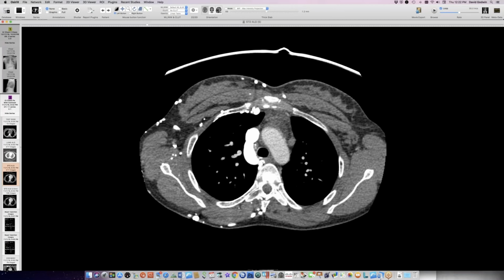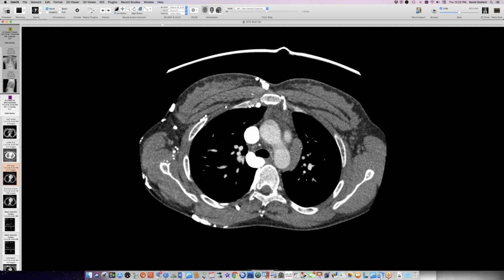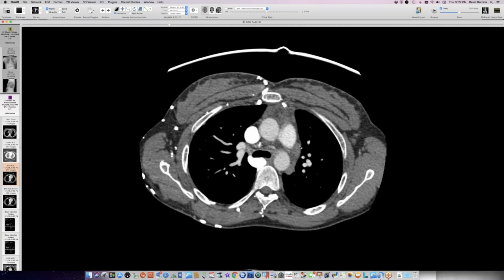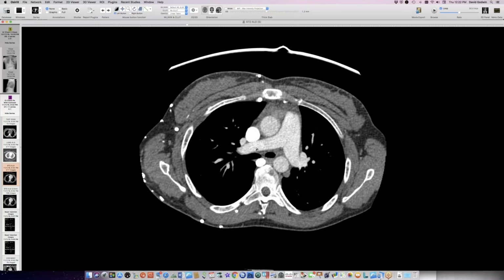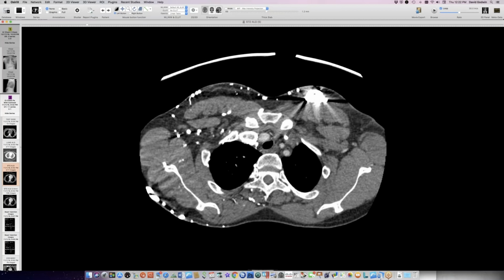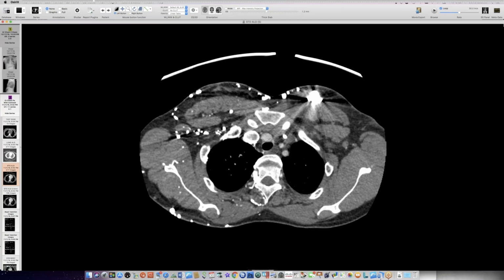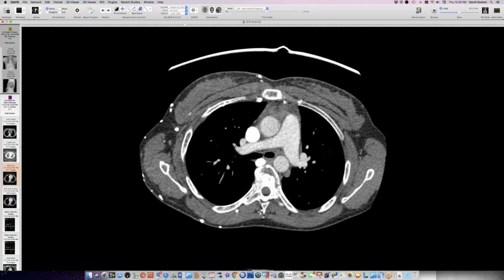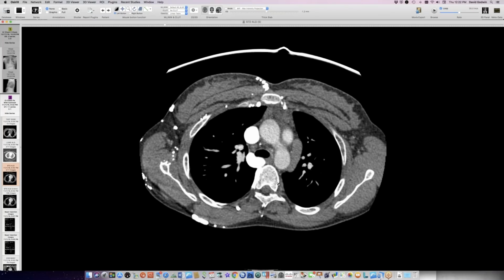This was not as visible on her imaging. So we've got these parallel channels here, a dilated left superior intercostal vein, which connects to the accessory hemiazygous posteriorly, and the azygous vein connecting here, all because of venous thrombosis. You can see all the collateralization subcutaneously because of her venous thrombosis from her sickle cell disease and her chronic catheters in place. So a very nice example of the aortic nipple, dilation of the left superior intercostal vein. Very nice.